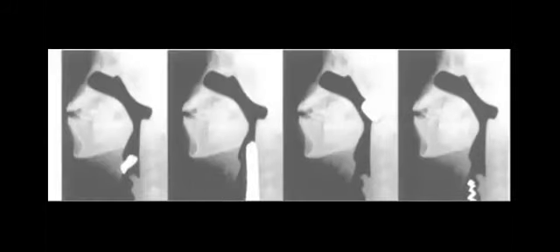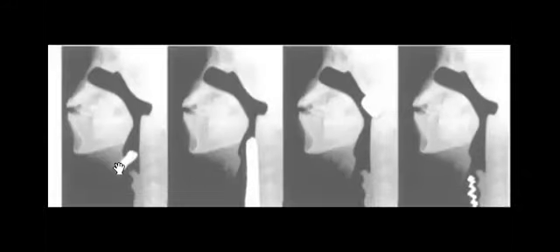Before we leave this area, let's just revise 4 patterns if you get the lateral, because this is also important in the exam. So I will show you and we can try to figure out which one. So this one, what is this sign called? Thumb sign. So you can put your finger here. So it is thumb sign. And it denotes that the patient has epiglottitis. Perfect. So this is epiglottitis.